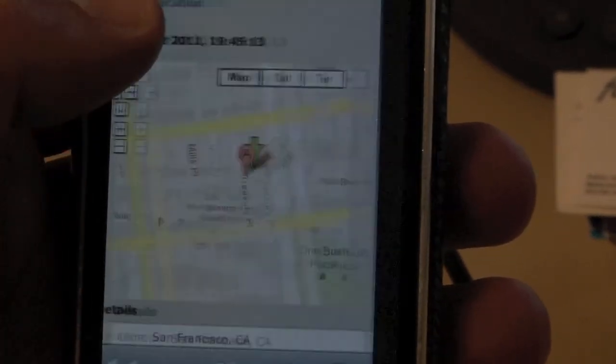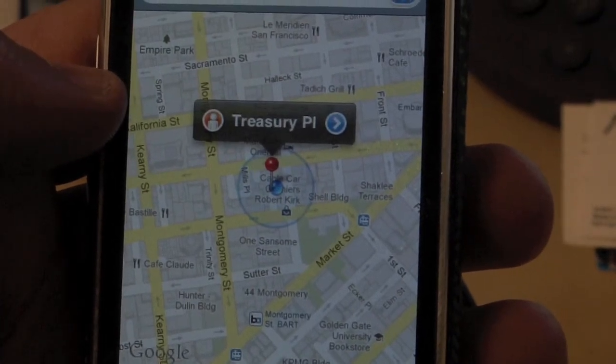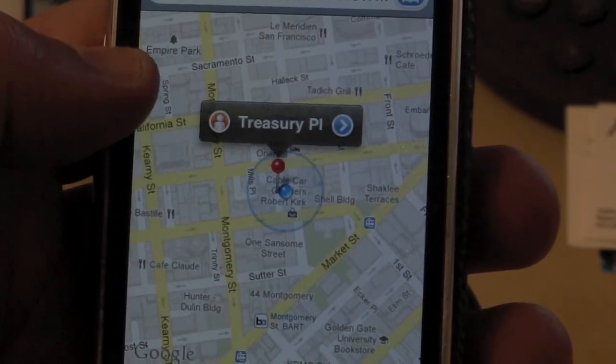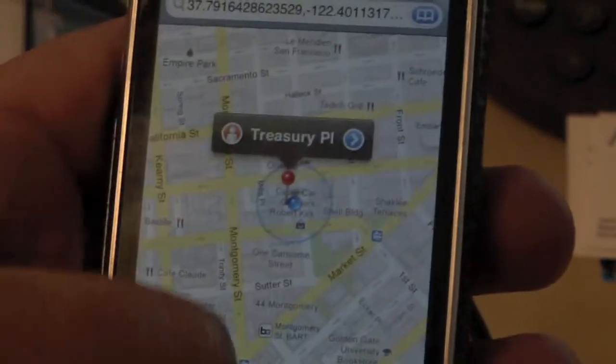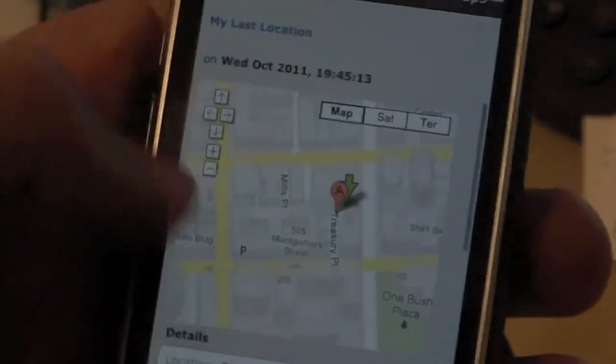And if I click here, I can actually open up the maps and find out exactly where that diabetic is. So right away I can find out whether this person is at school, whether he's at home, at work, make a phone call to people around him, and so on and so on. Now, if I go back here, again, this is the mobile device.